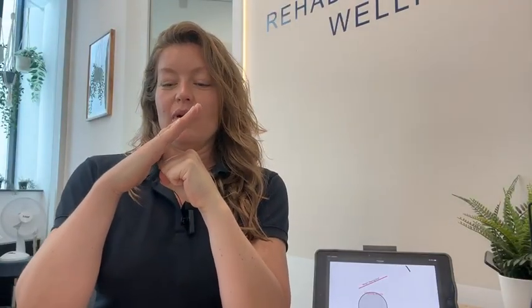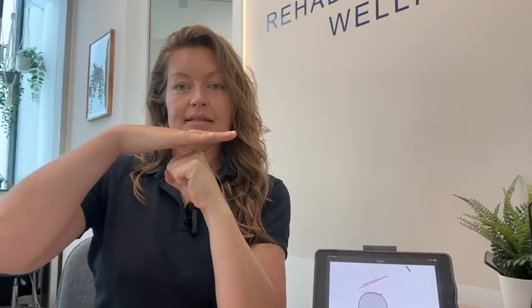So with this ball and socket joint, we are trying to determine whether the angle of support is like this, whether it's like this, whether it's like this, and again, how much stability we're getting from it. So this is just another representation. You won't always have this one done.